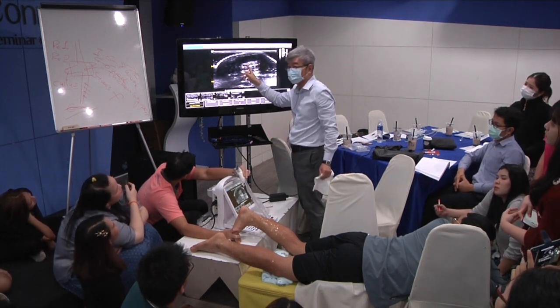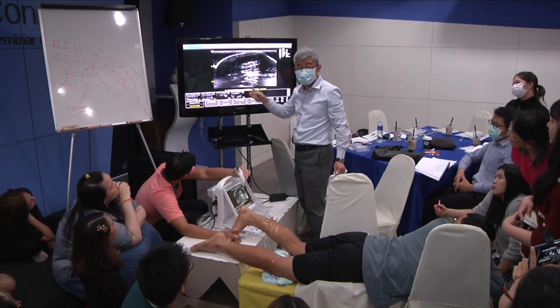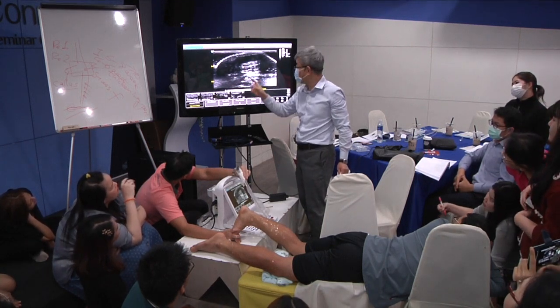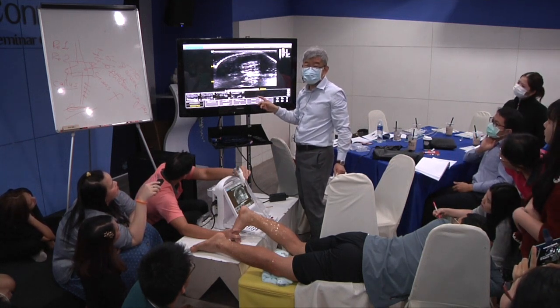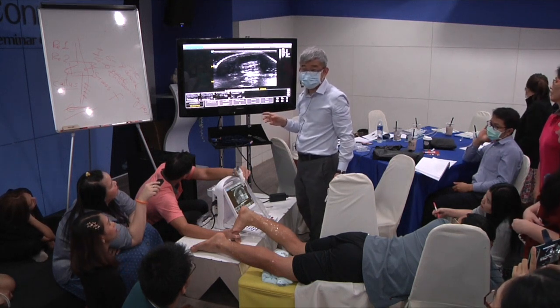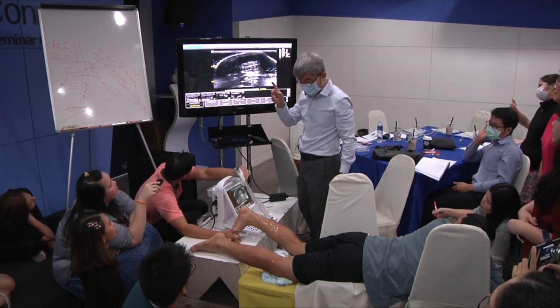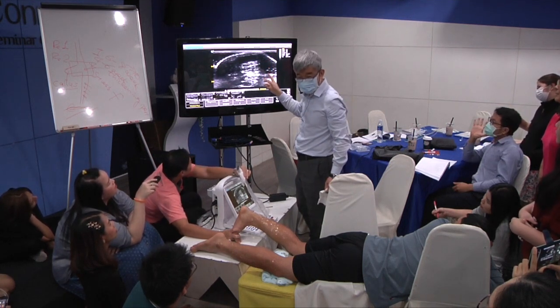Wrong. Plantaris. This is plantaris. Slightly different, right? The color, the brightness is slightly different, right? Most people, the paper I read published in a country above Taiwan, they have very famous sakura.